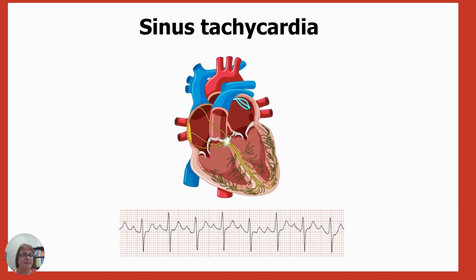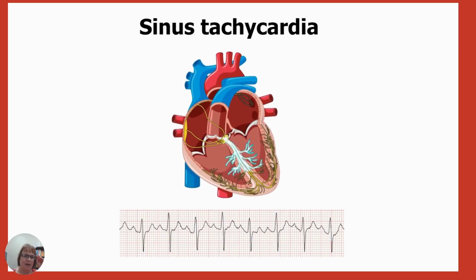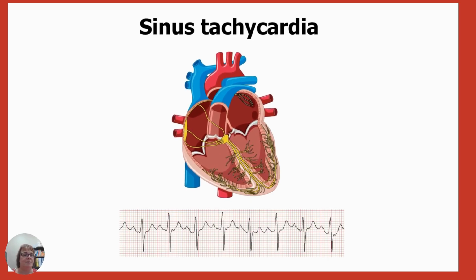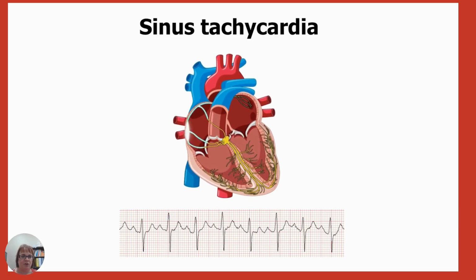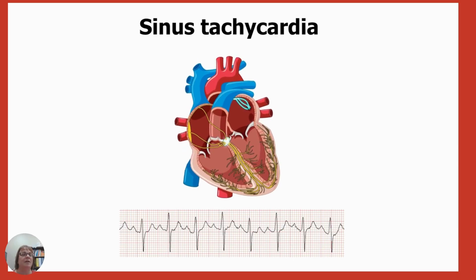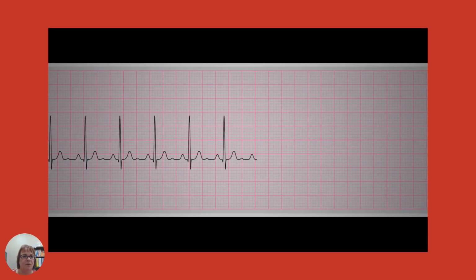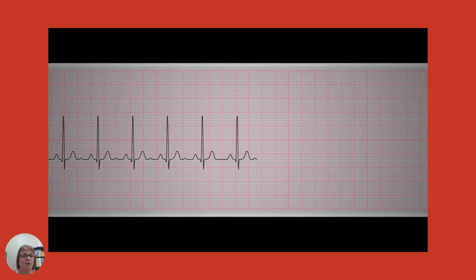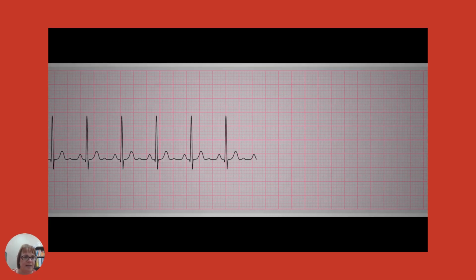Things that can cause this: energy drinks, stress, anxiety, panic attacks. Some medicines can cause sinus tachycardia. Fevers can cause sinus tachycardia. So this is what it would look like on the strip. This is any heart rate greater than 100 for sinus tachycardia.